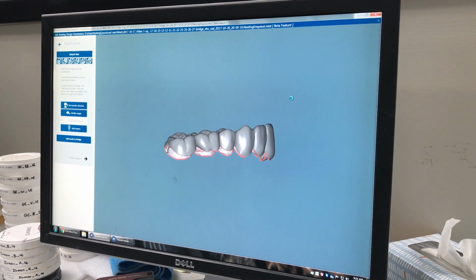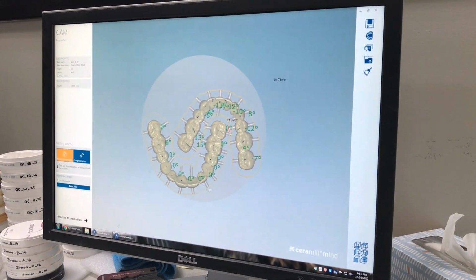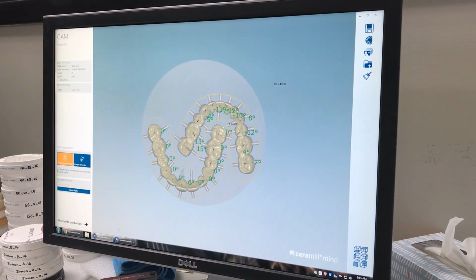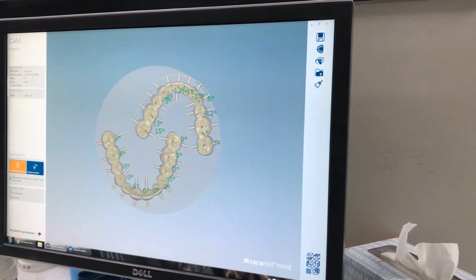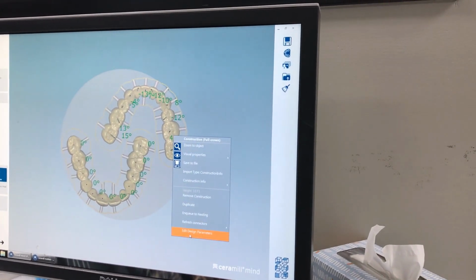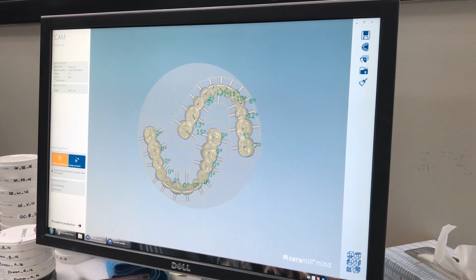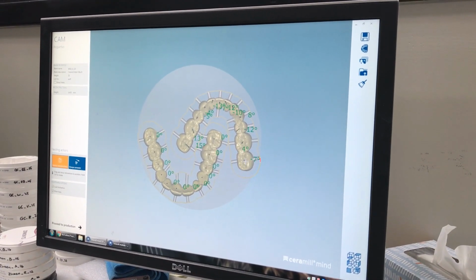Because the burr can turn around, but there are certain angles that it won't be able to go in, even though it's a mill that can go pretty far. It's a 5-axis. Yeah. You can mill up to, I think, 30 degrees. Can mill up to 30 degrees. Okay, well that's good to know. Thanks Tyler. Thanks Jung Mi.